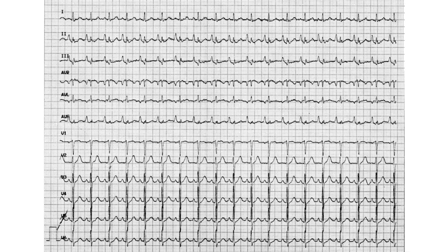The main thing I wanted to get across is that you've got to practice ECG, and you get better at it. If you haven't paused, pause and try it yourself, but we'll run through it. I'm quite glad that I found out this idea of the notepad, otherwise this would have been real weird to do. 1, 2, 3.